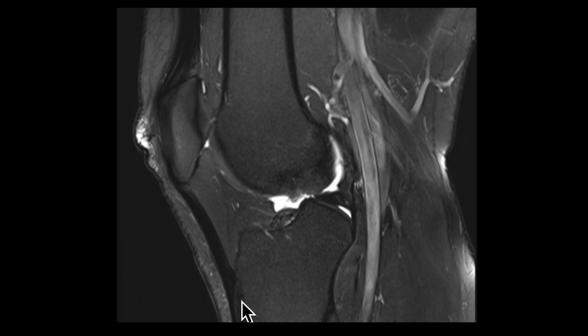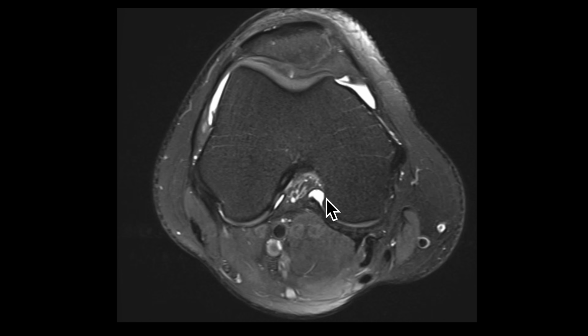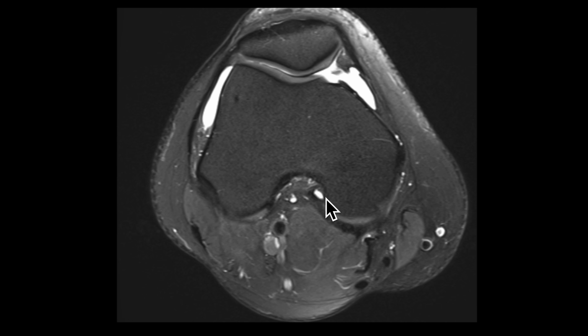The patella tendon is of particular interest with orthopedic surgeons for two reasons. In some cases, this tendon can be utilized to reconstruct a torn ACL. Also, in some cases, if the tendon is too long, so you have developmentally lengthened patella tendon, you might be at risk for patella subluxation and patella dislocation.